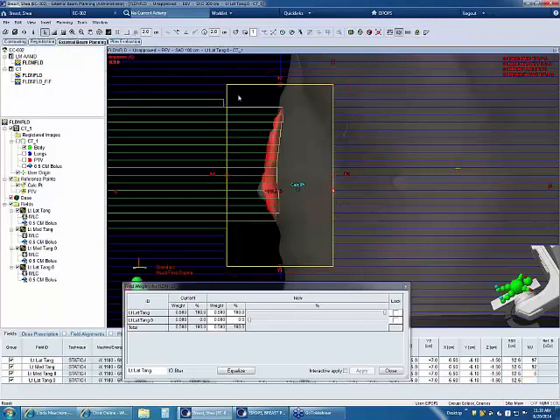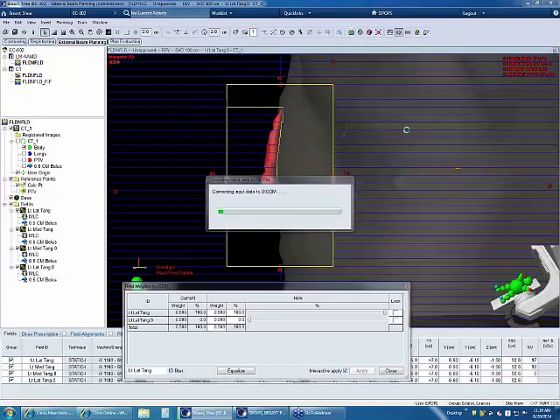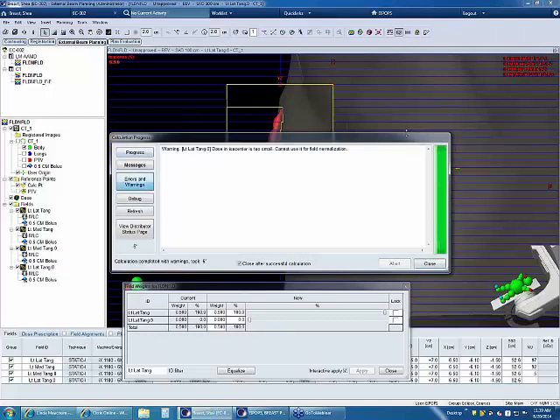And I can click inside here so that I can move these leaves just one at a time. Move this over like that, click inside the aperture, hit Interactive Apply, calculate your field again. It's only going to calculate the new field. And I'm going to close this.